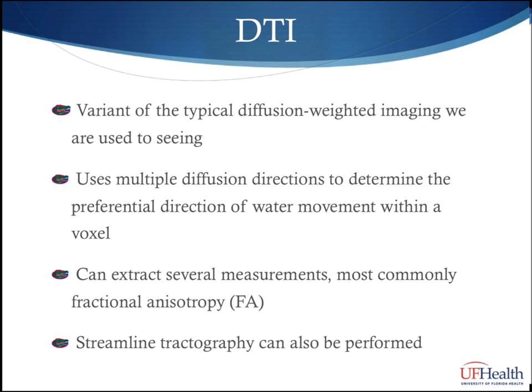Unfortunately, there are many confounding variables which we will not discuss here. Using these small vectors of preferential water movement, we can essentially connect the dots and perform streamlined tractography as well.